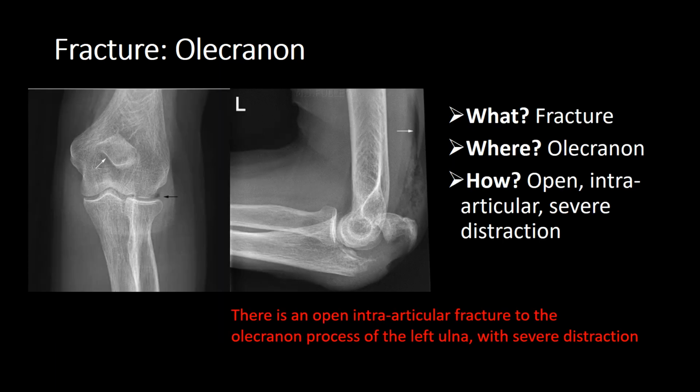So what is it? It's a fracture. Where? It's the olecranon. How? It's open, it's intra-articular, and there's severe distraction.